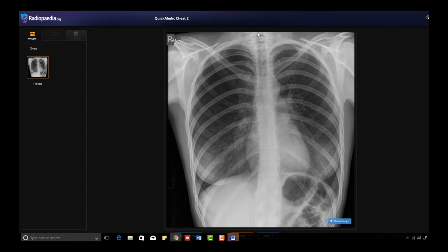Let's look at the airway. See the trachea going down here, it bifurcates. And that's okay. Looking into the branches, they look okay as well. Looking at breathing, the lung and the pleural spaces. So if we take this side first, this looks normal. You can see the breast shadow, bilateral breast shadow. This is a 25-year-old female. You can see the costophrenic angles here.